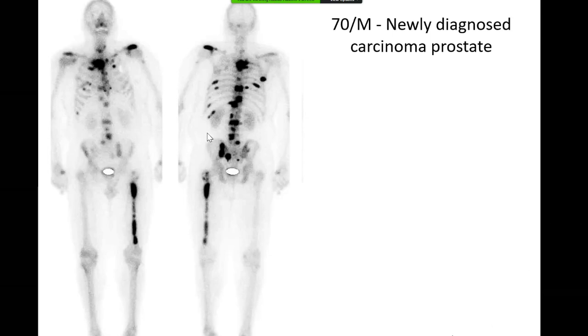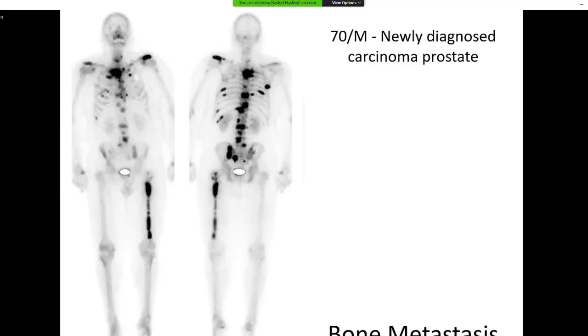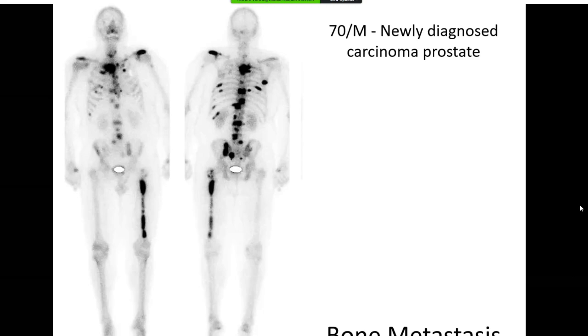Sir, actually I mentioned the kidney because I just wanted to mention that this is not a super scan. I got that point. So that's an important distinction to remember. But do also remember that if these images are acquired not after 3 hours, but for some reason beyond 4 or 5 hours, the kidneys can be more faint. And then just using that one distinction to separate from the super scan may not always be a very good strategy. So we'll come down to that in a while.